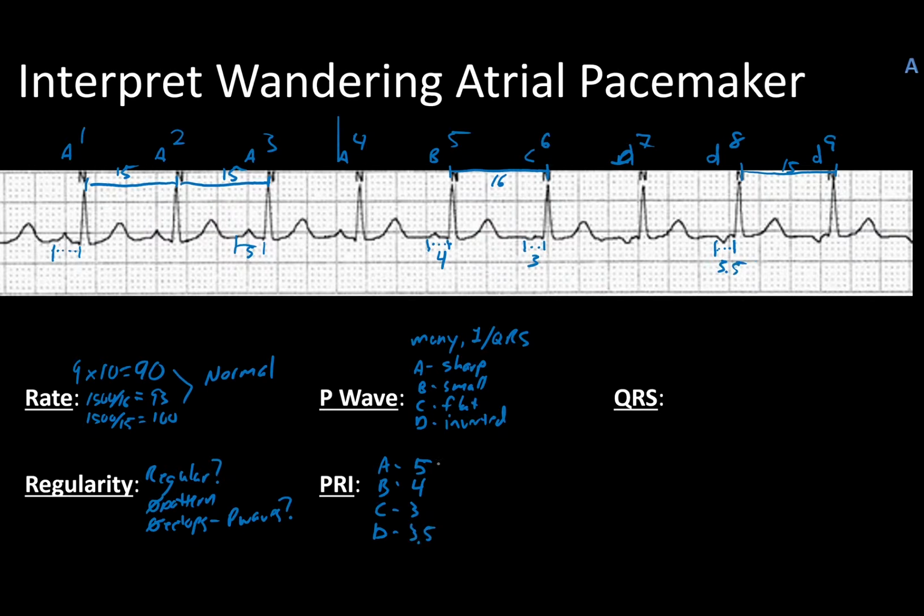So if I multiply these times 0.04, all of those are actually normal.